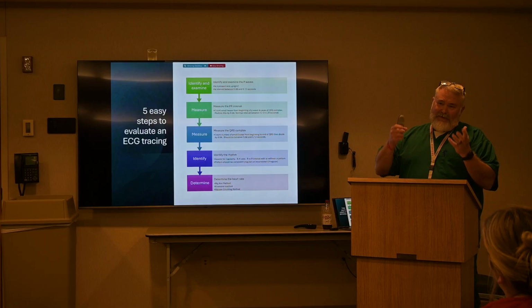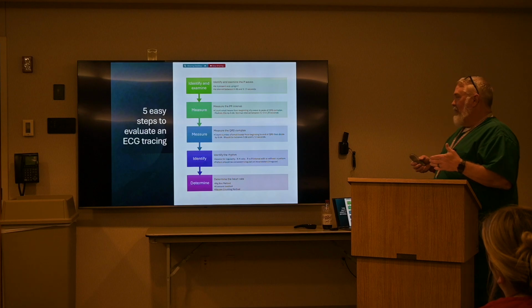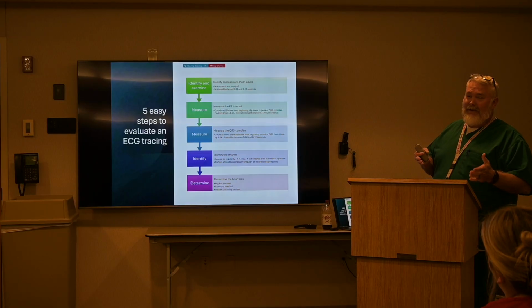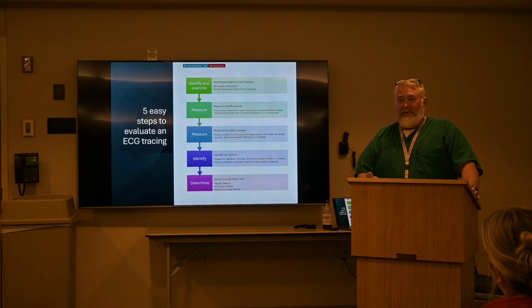Now, we had some discussion about this in our earlier classes, that technically, to measure a PR interval, it says to go to the peak of the complex, which would be the R wave, which is the PR interval.